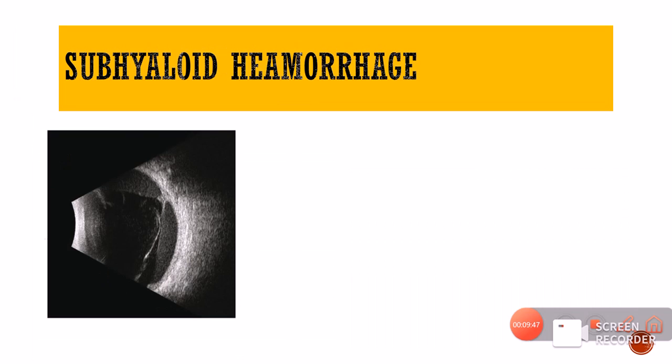Now this picture over here shows us the subhyaloid hemorrhage in a patient who is diabetic. You can see that this is the PVD, that is a posterior vitreous detachment, and from below the PVD and in front of the retina is a subhyaloid space. And in that subhyaloid space we can see the same dot echoes, very fine dot echoes of low reflectivity, and these dot echoes which are present in the subhyaloid space are nothing but the subhyaloid hemorrhage.